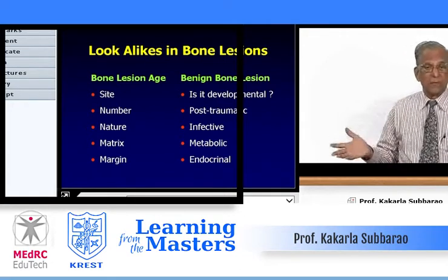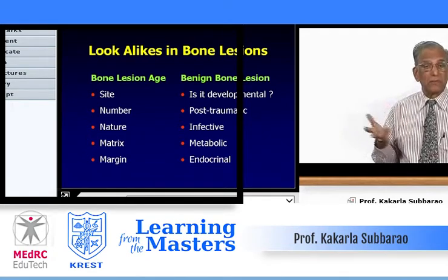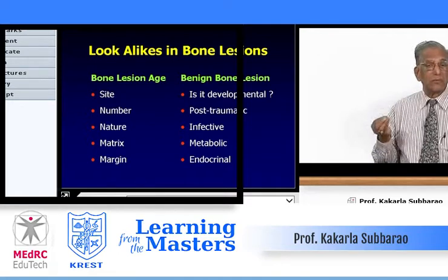But he may be asymptomatic, but in your own mind, a 50-year-old man comes with a lytic lesion in the iliac bone, you have to think of myeloma, metastasis, lymphoma. Occasionally tuberculosis also can produce it. Multicentric tuberculosis is not uncommon, particularly in patients with AIDS. So these things we have to keep in mind and look at the number.